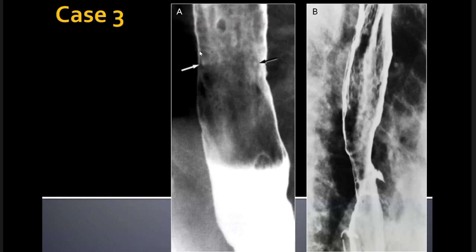Okay. So you can see this, as you pointed out, this target appearance, which is basically caused by a round raised mound in the mucosa with a central pit, which is where the barium sinks into, which gives this kind of target-like ulceration. And as you rightly pointed out on the second spot image, you've got narrowing of the lower esophagus. It's very well done. You pointed out a small defect there. That actually was a surgical defect, so we can ignore that.